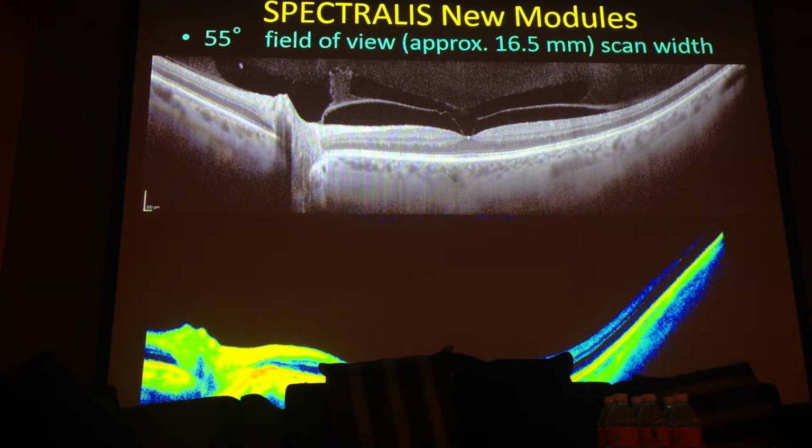You know that the lateral resolution is dependent on the number of A-scans on this line. If you concentrate all these 256 lines on 2 millimeters, we have a very high lateral resolution. If you enlarge these 256 lines on a very large scan, you reduce the lateral resolution. So as we can increase the number of A-scans, we can increase the length of the scan and keep the lateral resolution at a high level.